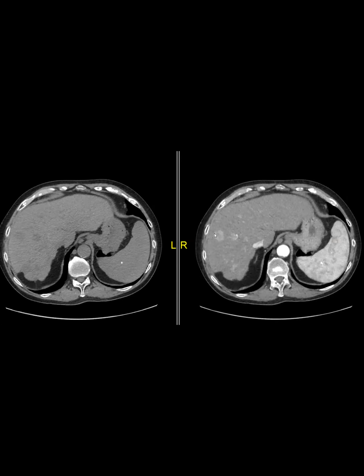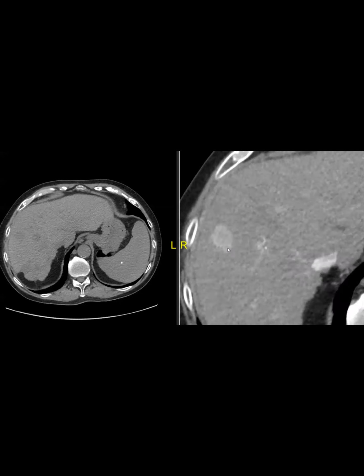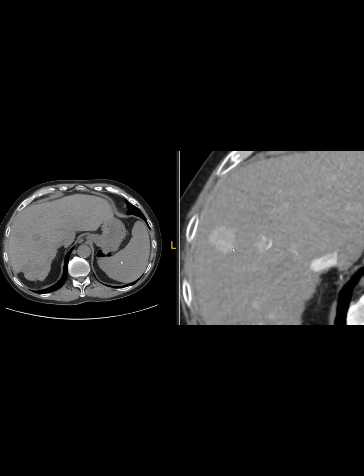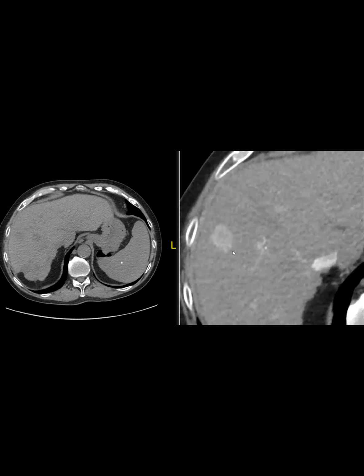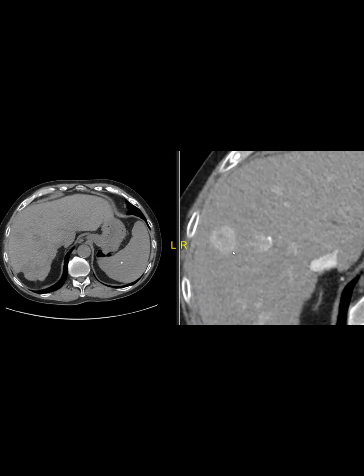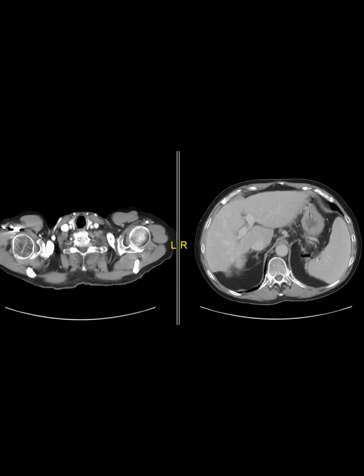You can see arterial phase hyperenhancement, but as I was scrolling up and down, it still had a rim-ish look. I wasn't sure. I know that if you're not sure, rim versus non-rim, we're supposed to go with rim. But I was like, am I just being too demanding of this tumor?